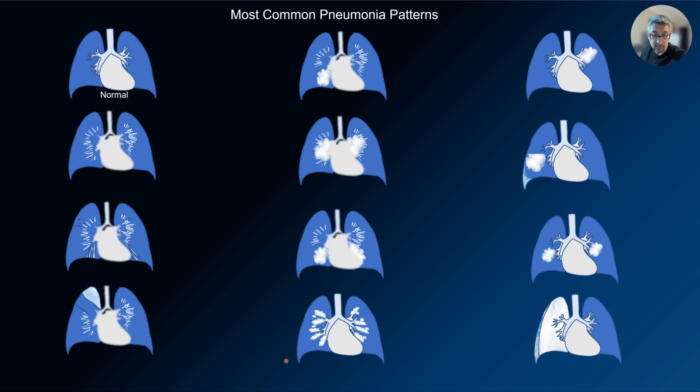They can be bilateral. We can see a bronchopneumonia type. We can see just focal consolidation. Consolidation can be associated with pleural effusion. Bacterial pneumonias can be associated with pleural effusion, and this is a helpful feature. Viral infections usually do not, and atelectases do not. So that is important for the differentiation. You can have bilateral pneumonia, and sometimes we see an advanced bacterial pneumonia causing a white-out lung, and this may be associated with pleural effusion as well.